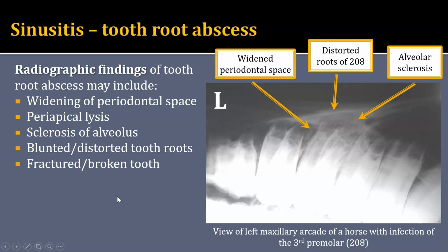So what we are going to look for, besides probably identifying increased fluid, soft tissue opacity in the sinus, sometimes actual fluid lines, are teeth that are affected. And remember that the caudal maxillary premolars and the rostral maxillary molars actually have their roots that are in and closely associated with the sinuses, and so that is why when they get infected, the sinuses are oftentimes involved.